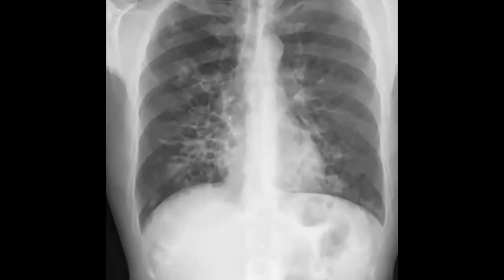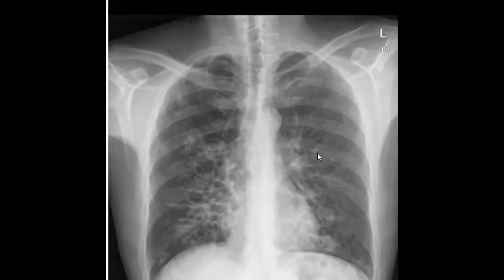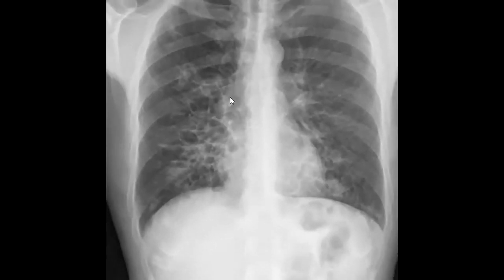And let's finish today with this as a last case. We started with allergic bronchopulmonary aspergillosis with a type of bronchiectasis, and we finish again with bronchiectasis, which here is a type that is more central, and probably there will be a question for you: what is the differential diagnosis of cystic bronchiectasis when it is central type?